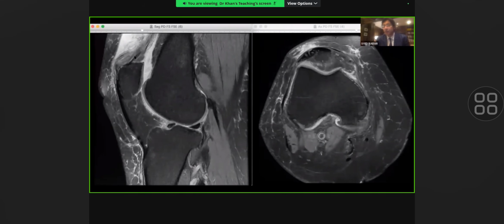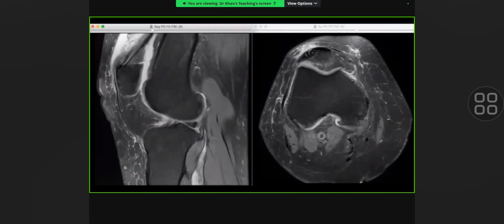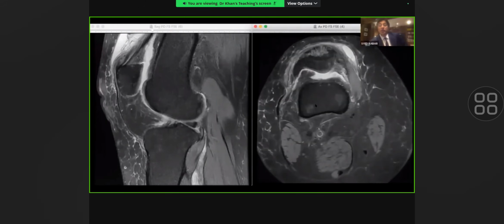Did I hear anything from you on those accounts? I said full thickness, but not in the summary. Now, are you sure it's a full thickness? Just looking at this, I can easily say so, but I can still see some tendon fibers. Other than that single tendon fiber, I think most of it is gone. So I would say this is high grade. So now you're changing your diagnosis to a high grade partial thickness tear. Is that right? Yes. Or are you saying still a full thickness tear?